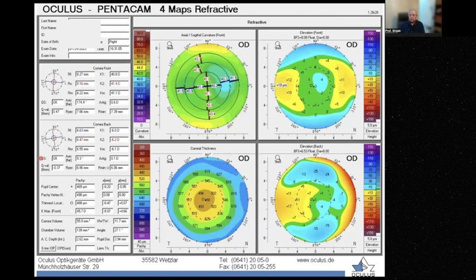Why must I make topography for cataract patients one of the categories in the checklist? It is a must. Who can say why it should be? IOL selection, very good. If I need toric or not, EDOF or not, very good. To know if the astigmatism is lenticular or corneal, very good. Corneal astigmatism and toric IOL, super.